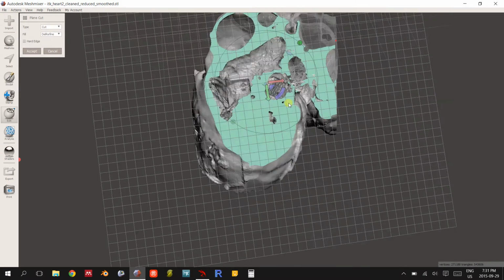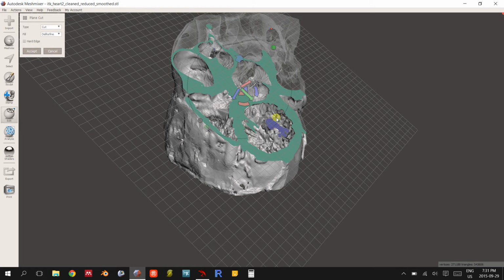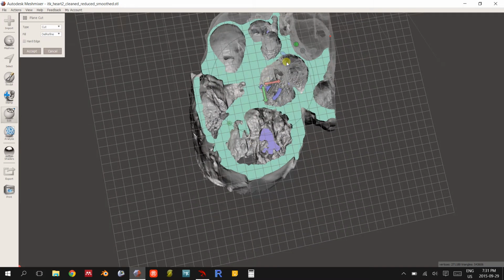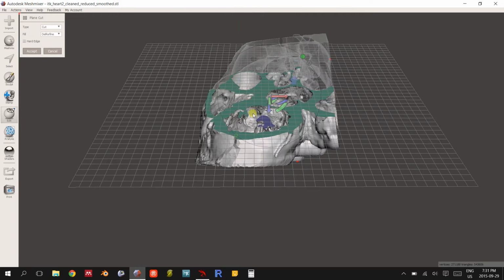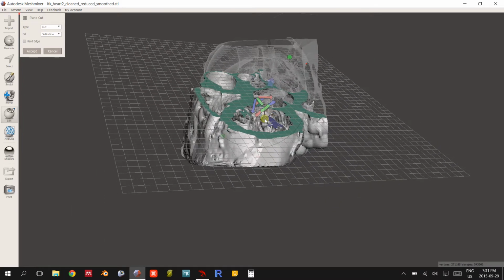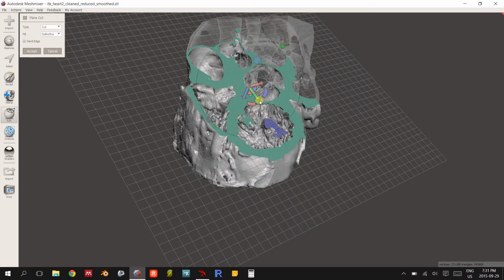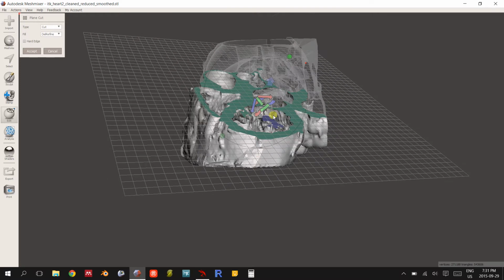So this would just be the roof of the left ventricle, for instance. But we can just scroll past that a little bit, and there you go. Atria, right ventricle, left ventricle. Parts of the aorta are somewhere back there. You can see the aortic opening here, and where the semilunar valve would be. I think it's semilunar. I have to admit my cardiovascular physiology is a little bit off right now.